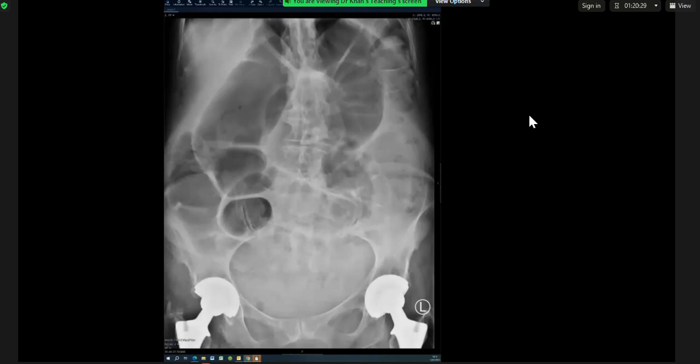So, level of cecum. You think this dilated loop is cecum? Which one? This one, this big one? No. Or this one? This one may be the right colon. Okay. So if the right colon is dilated, would the obstruction be distal to the right colon or proximal?